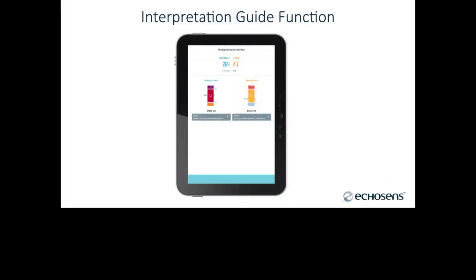So let's review what would actually be produced on the screen. Echosens does not publish or promote any specific set of threshold values. All we do is make it convenient for you to compare your patient's values to published reference sources. And so you will be in absolute control of selecting what published threshold reference you want to use on each specific patient. So I want you to notice in this case, we have a hepatitis C patient, and that patient's values for CAP and VCTE are entered above.